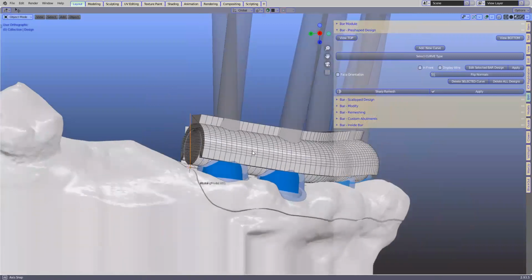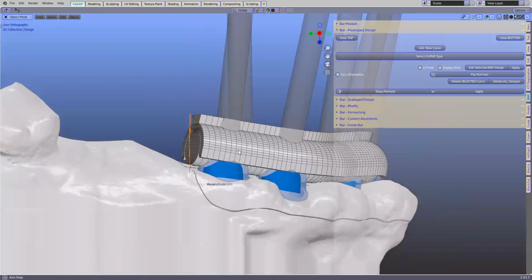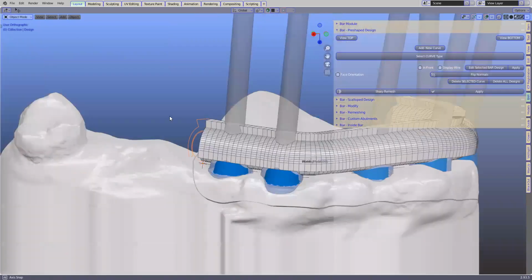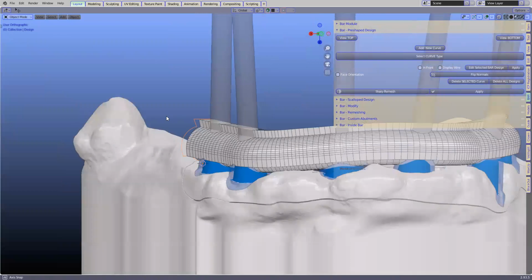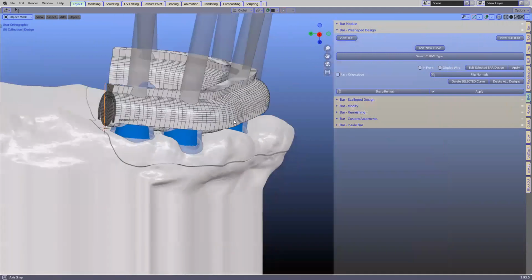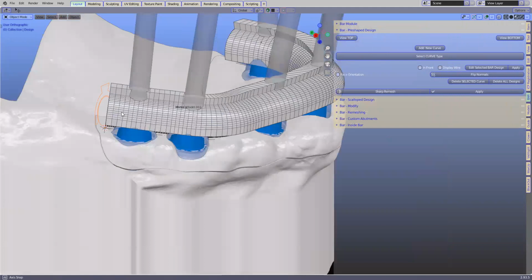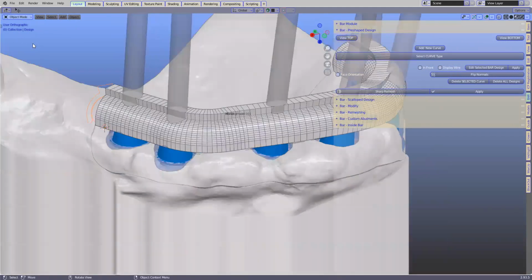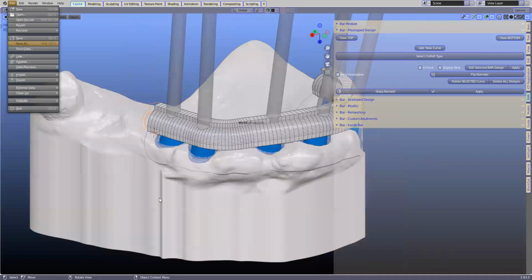We're going to do a few experiments with this, because we all know you can buy the Preciline attachments, those yellow ones that clip over the top. But we've been dabbling with the idea of actually having that nylon printed. So we've got this nylon printed, and then we can have the other one joined to the bar. So I'll just save this file so we can get into this in a minute.